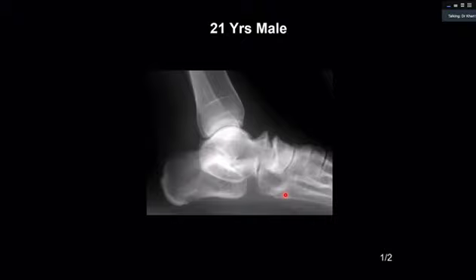Bony bar is not very convincing. It's overlapping. No. A bit of stretch of imagination. There is a sign there. I want to hear the name.